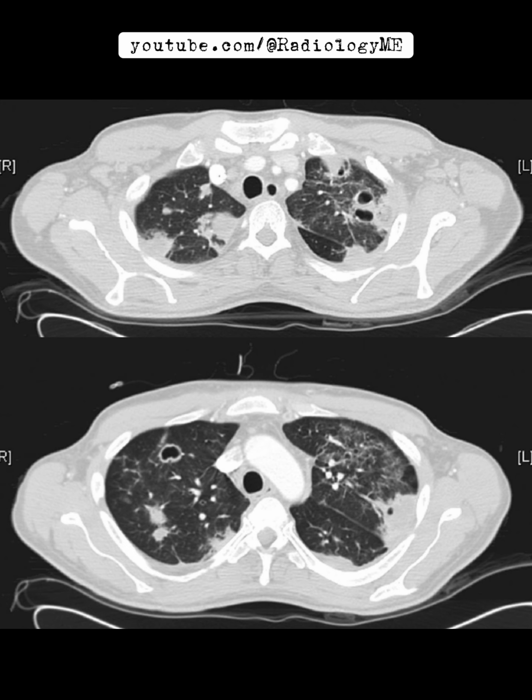Now let's talk about the differential diagnosis. Given the findings of cavitating nodules and peripheral-based infarct-like opacities, the primary differentials I'd consider are multiple pulmonary infarcts, especially considering the wedge-shaped opacities and the patient's age. If there's pulmonary artery dilatation or signs of emboli, it makes this even more likely. Septic pulmonary emboli: if this patient had a history of bacterial infection, we could consider emboli due to something like Staphylococcus aureus or Klebsiella. Wegener's granulomatosis, now called granulomatosis with polyangiitis, is another strong contender.